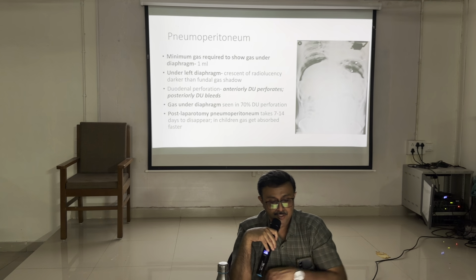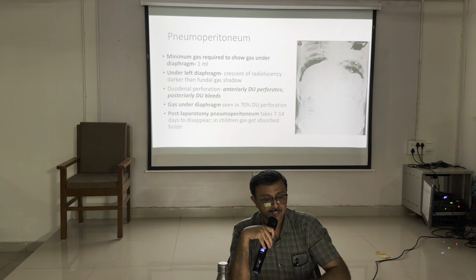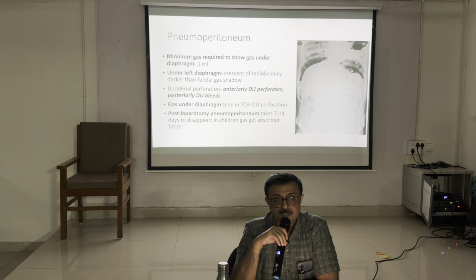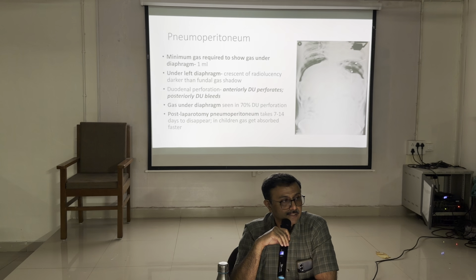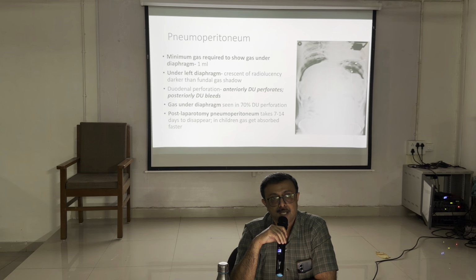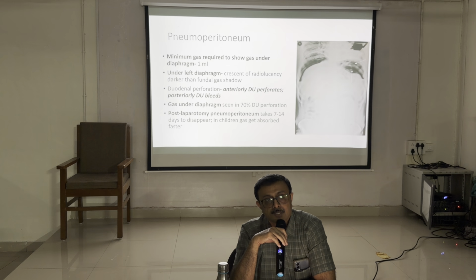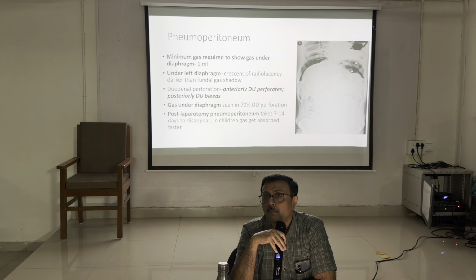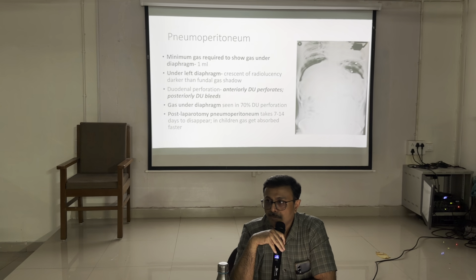Okay? So when you identify free gas under the diaphragm, that is suggestive of pneumoperitoneum. And causes of pneumoperitoneum: perforation of a hollow viscus, and post-operative, open or laparoscopy.